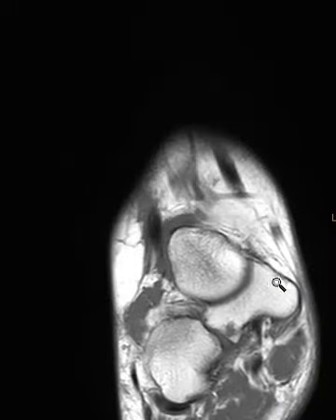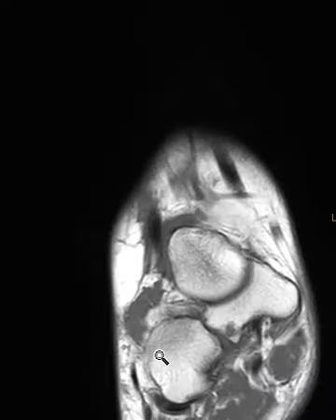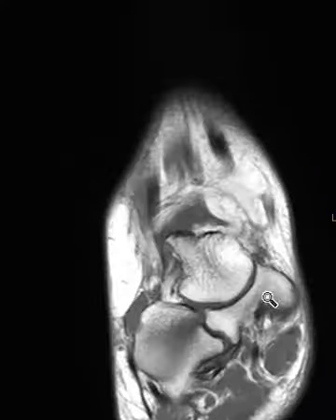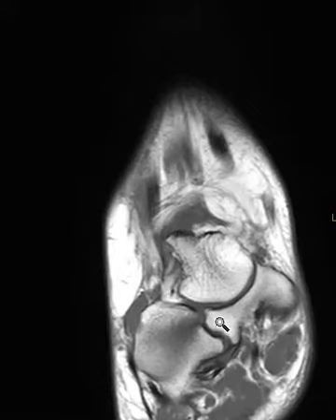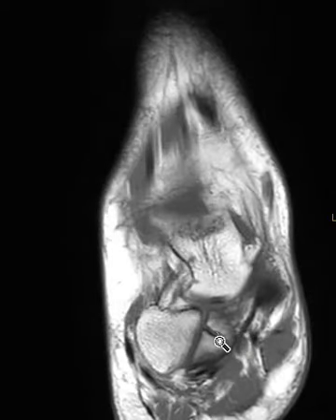This is the navicular bone, and this is the cuboid bone here. And where they come together, we have this broad anomalous articulation, sort of a rare coalition. It's not an osseous coalition because the bone doesn't go across, but we could call this a cartilaginous coalition or a fibrocartilaginous coalition because there's cartilage there and maybe fibrous tissue, but there's no, again, ossification across. There's also another one over here.